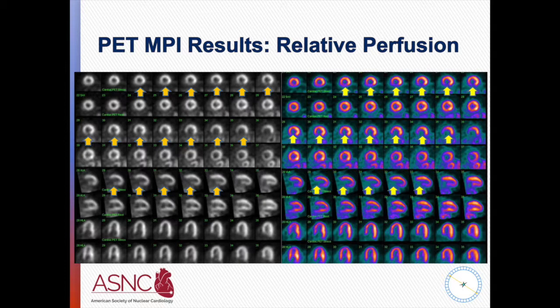And we see this severe defect inferoseptally. What makes you confident that this is not an artifact of some kind?